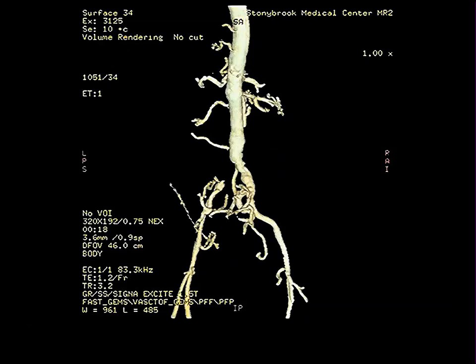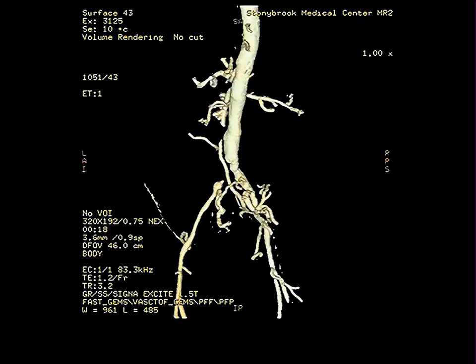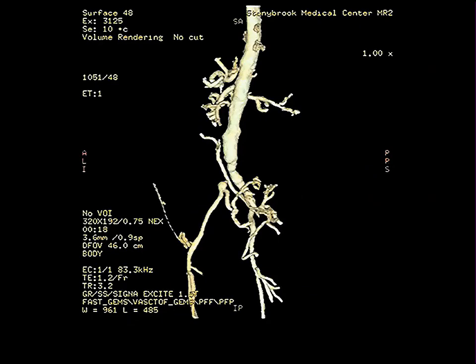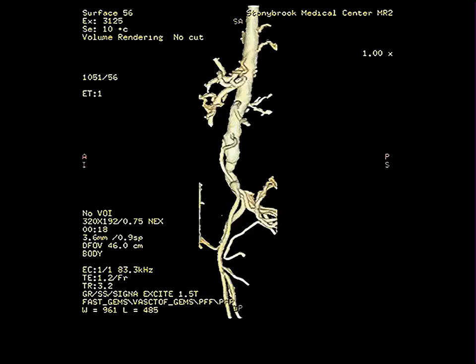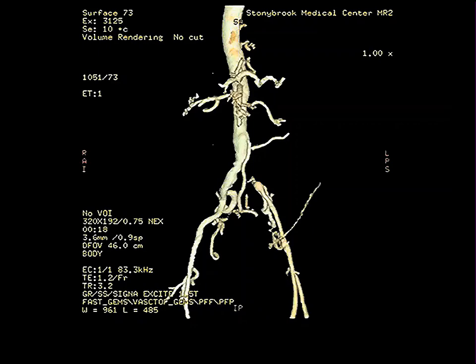We see the first thing that we saw really wrong again. And we're wrapping all the way around to another side view. Second thing is wrong. And then we're back to the beginning. So anybody want to venture what they see is wrong? First thing, second thing, or anything? You just yell it out. I mean, it's so obvious.